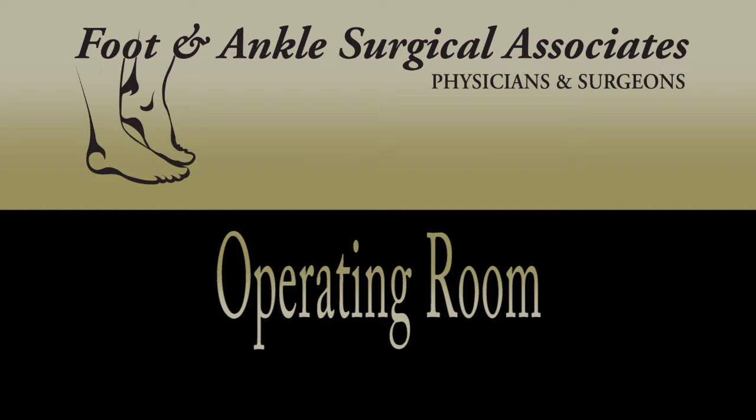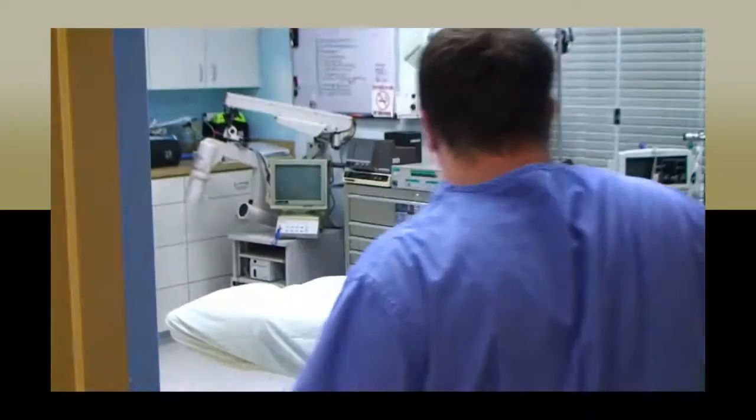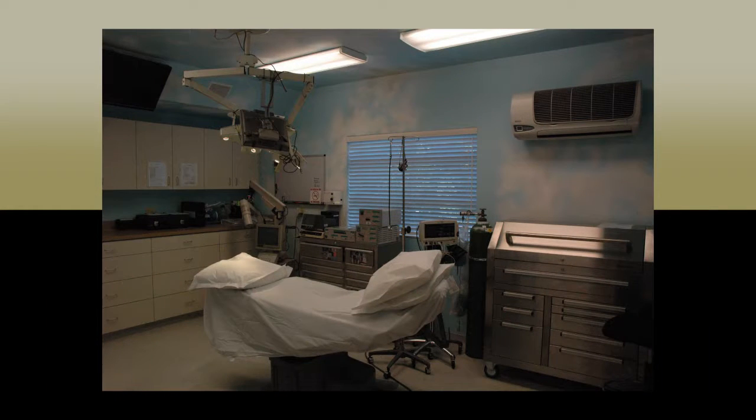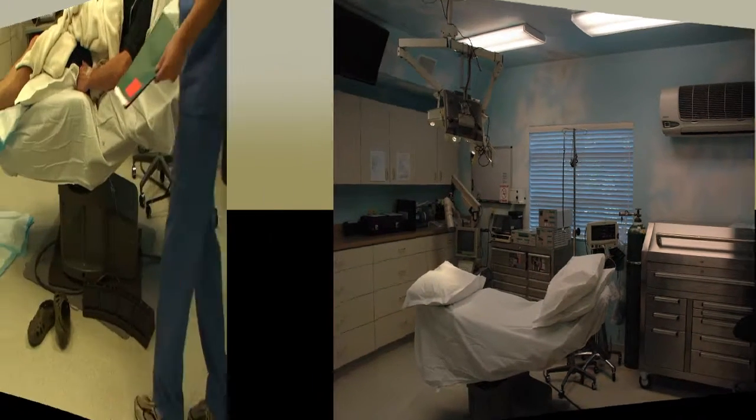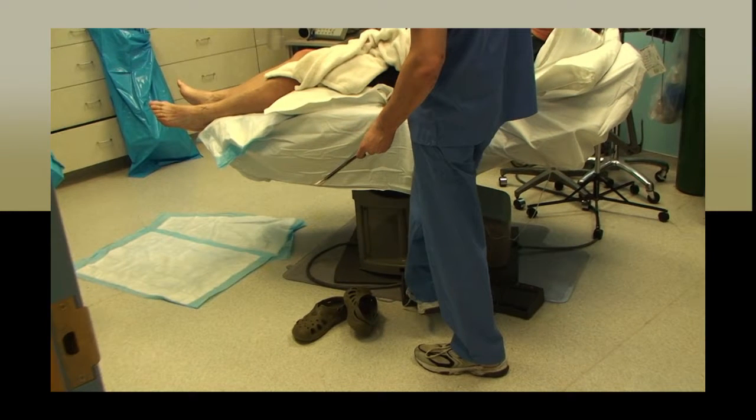This is where all surgical procedures will take place. When first entering the room, you'll notice an operating table. This table is a multifunctional table designed to place the patient in the position that is most safe, accessible, and comfortable for the physicians, patient, and you. The pedals that allow for movement are located on the floor next to the base of the table and can be operated by pressing the buttons with your feet.